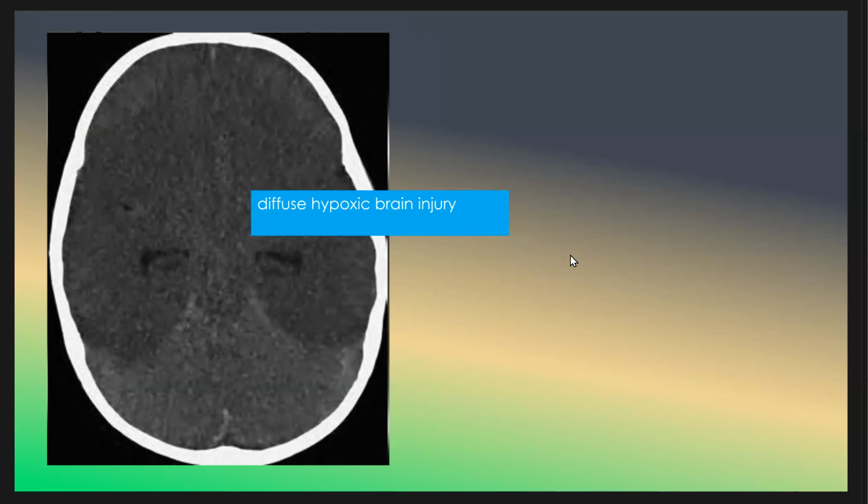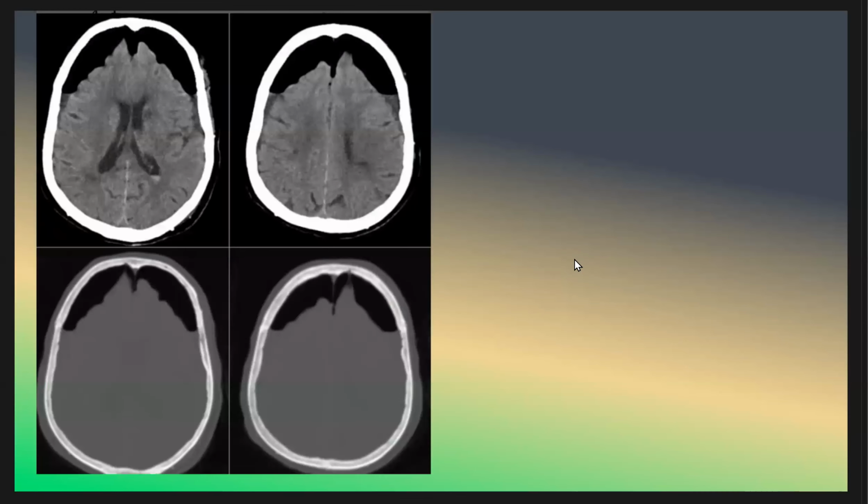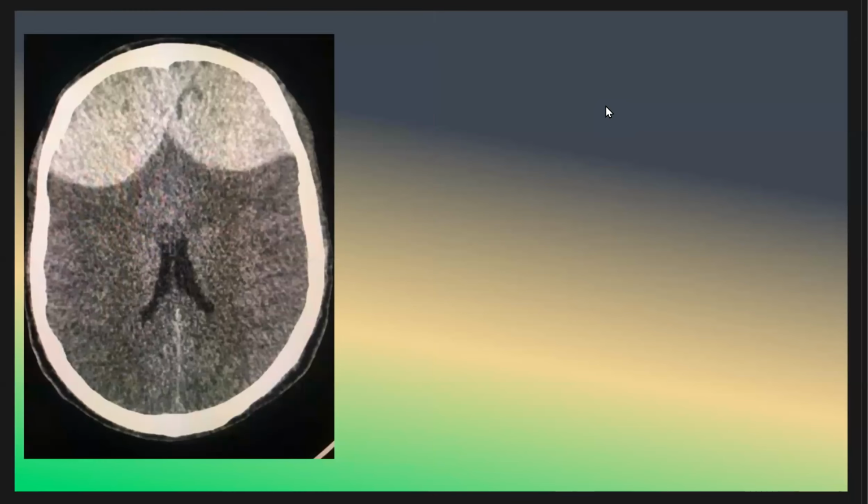This patient has soft tissue window for the brain and bone window for the brain, and this patient has tension pneumocephalus, and the sign is the Mount Fuji sign. This is the Mount Fuji sign, as we see here, and this is tension pneumocephalus and should be operated on immediately to relieve the tension pneumocephalus. Okay, we move to the next case.